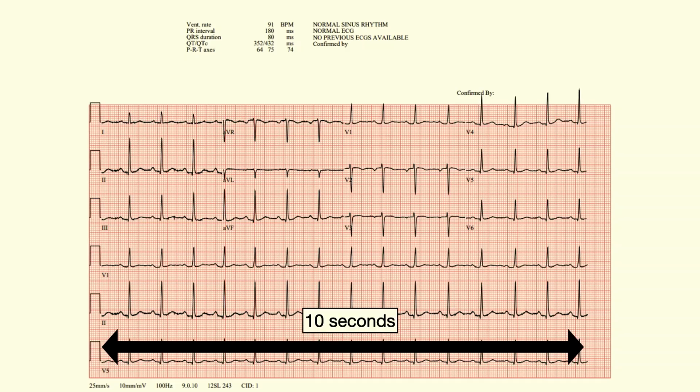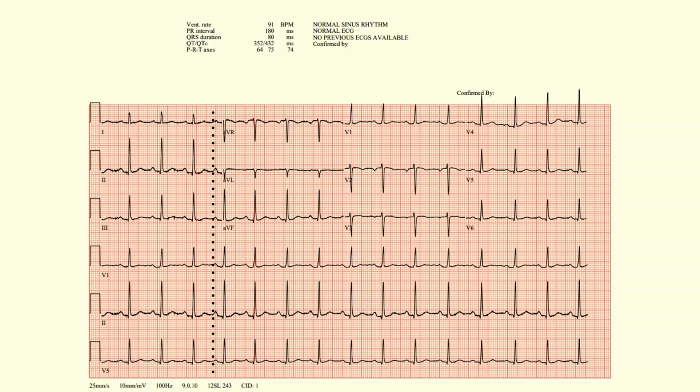Now, an important fact about ECG is that everything that's vertical on the ECG is simultaneous. And that's really helpful if you're trying to figure out the timing of something in one lead, but the waveform is not easily identifiable there. You can just draw a vertical line, and you can look at a neighboring lead where the timing might be more clear. So if the QRS looks narrow in one lead, but it's wide in another lead, you know it's really wide, and comparing those two leads by dragging that vertical line of reference can help you identify the timing of events from one lead to the next.